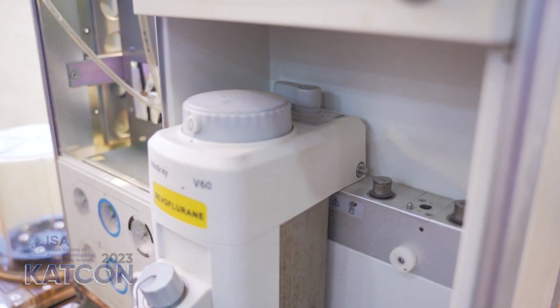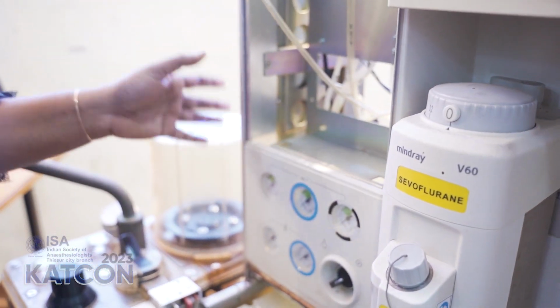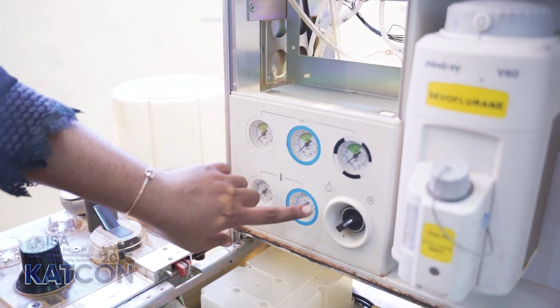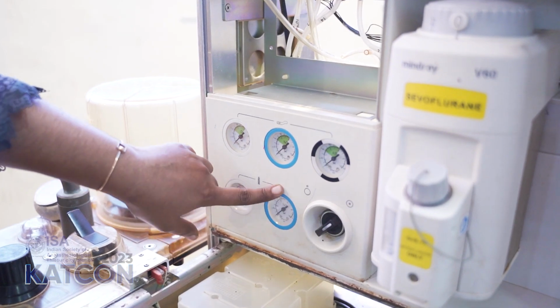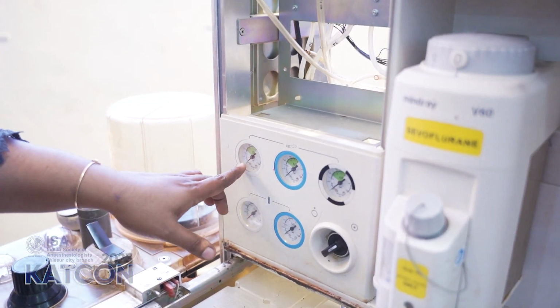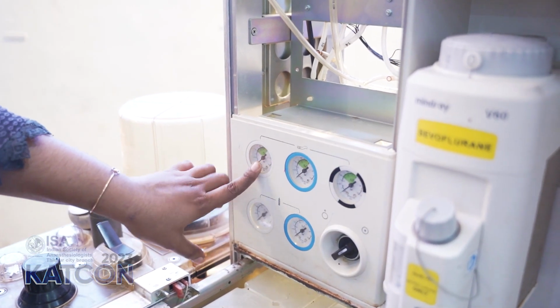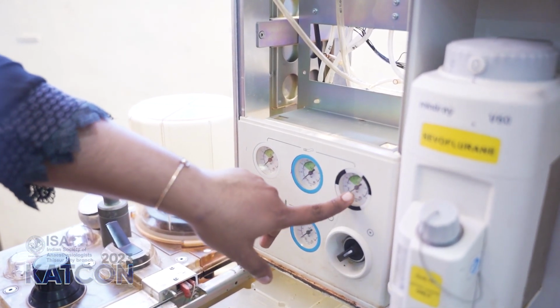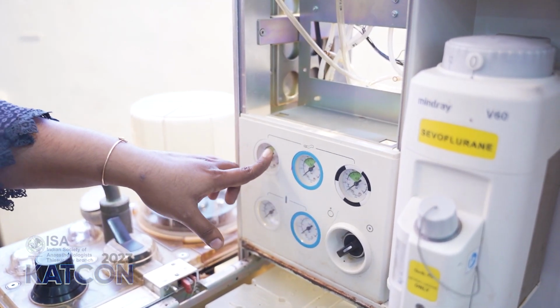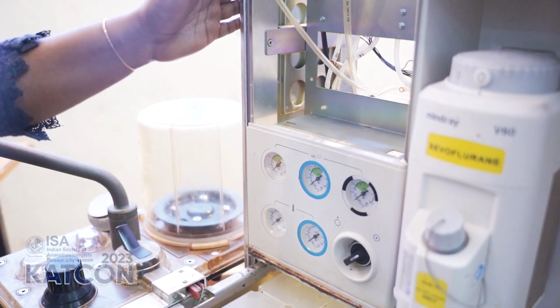Next it comes, this is the primary thing where two or three cylinders will be attached to the workstation. First of all, we should check the cylinder, and we should ensure the pressure gauges show the capacity of the cylinders. Then next, when we connect the gas pipelines to the central supply, it should display on the pressure gauges. We have the oxygen pressure gauge, nitrous oxide, and air also. So if we connect it to the central supply, the gauges will be moving, and it shows whether the gas is coming to the machine or not.